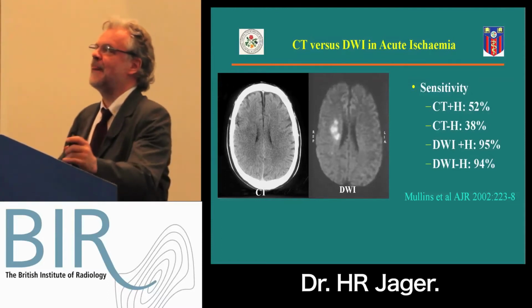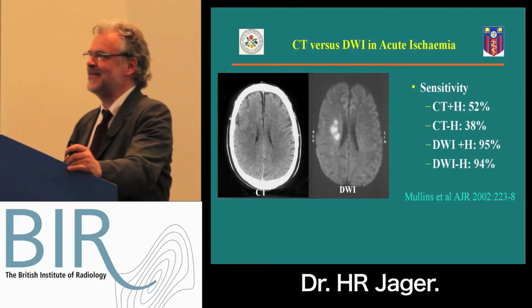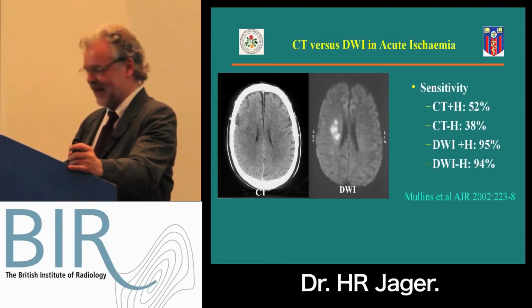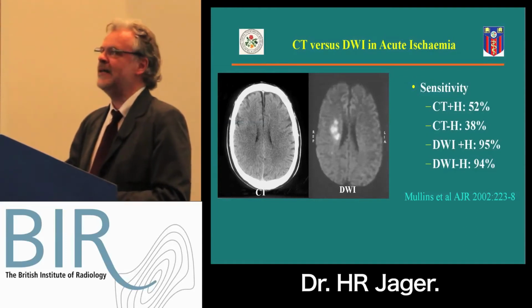And my former head of department, Dr. Ivan Mosley, whom some of you might know, called the diffusion weighted image the GP sequence. So the GP can diagnose the stroke. Okay. Now, when do we really need it?